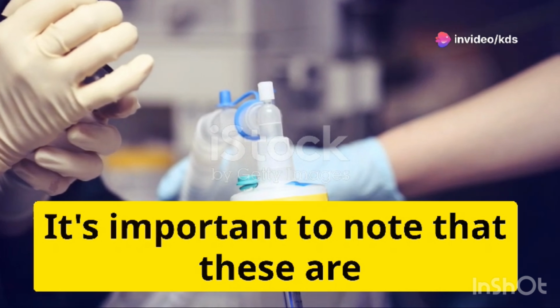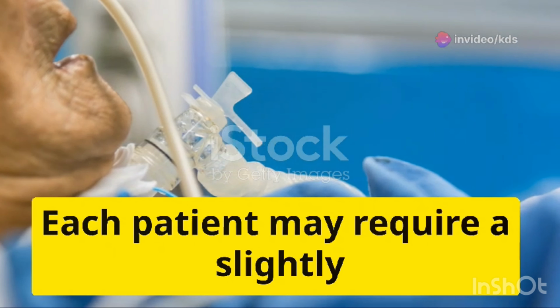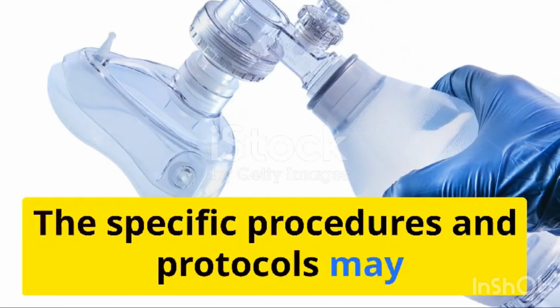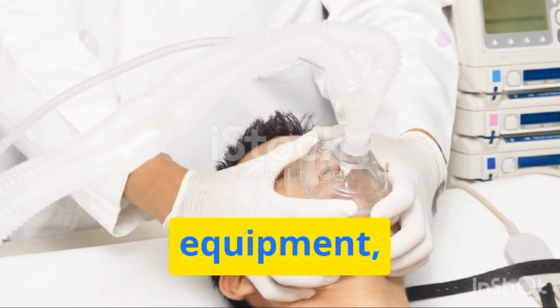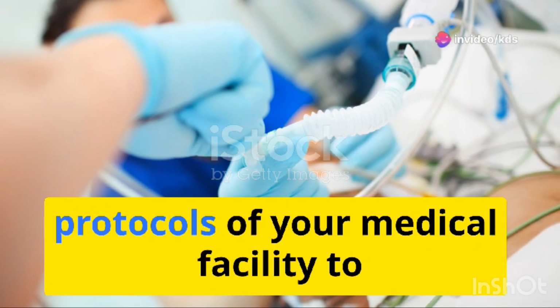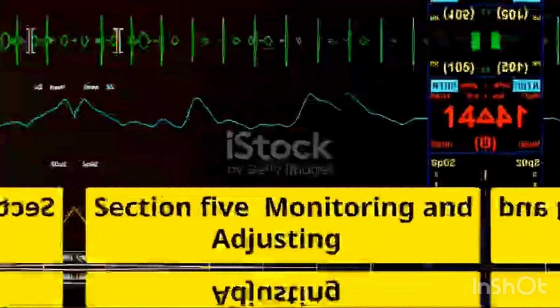It's important to note that these are just general steps. Each patient may require a slightly different approach. The specific procedures and protocols may vary depending on the hospital, equipment, and patient's condition. Always follow the guidelines and protocols of your medical facility to ensure the best care for your patients.